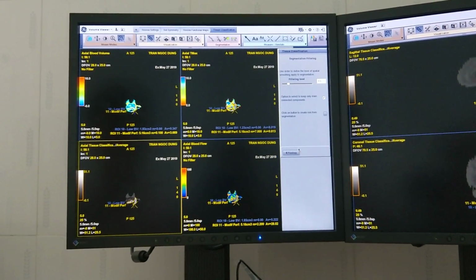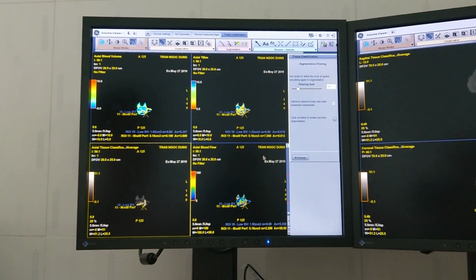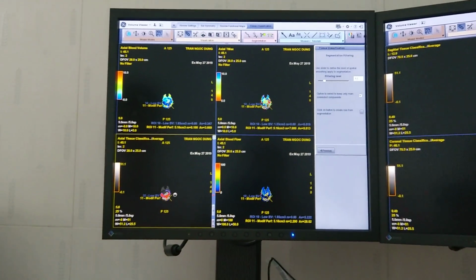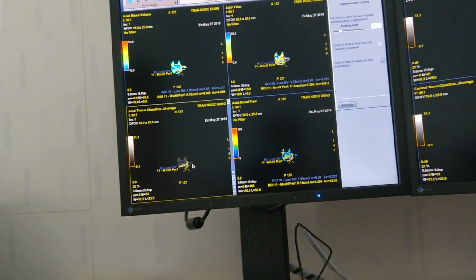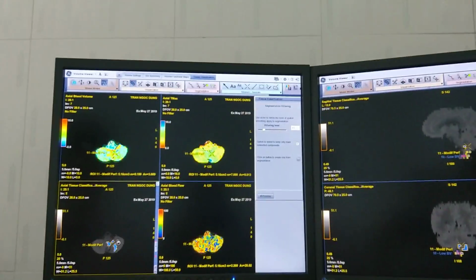Nhưng mà cái phần này nó nằm gần ở kia nên sky thì tắt đi luôn. Có tính được diện tích không á? Anh thử diện tích không? Tính được diện tích có bao nhiêu cm vuông không? Tính được thể tích. Tại vì hôm qua thấy trên máy của bạn này có hiện cái cm khối ở bên đây. Có. Cái này có chứ.